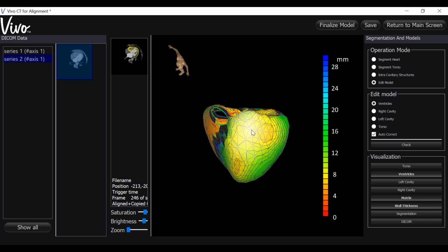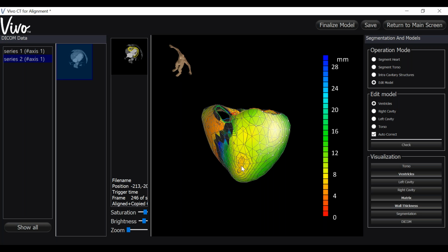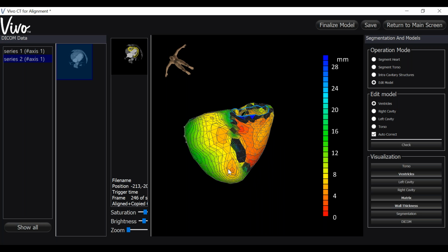Now just go a couple clicks at a time with your mouse so that you don't get errors. But when you want to move to a new area, you just hit Control, place the white area where you want it, and then shift and scroll wheel up. It's as simple as that. And a couple more areas here.